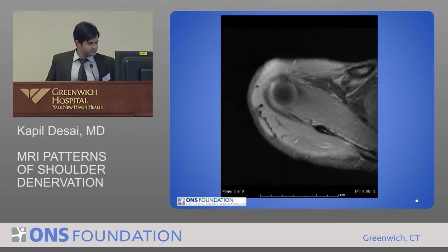On the axial image, sorry about that. On the axial image, you'll see the same thing. You'll see the nerves coming up through here, over the scapula, coming down posteriorly from the suprascapular notch down into the spinoglenoid notch. Bunch of tubes and lines running through.